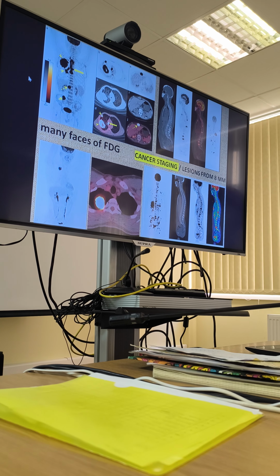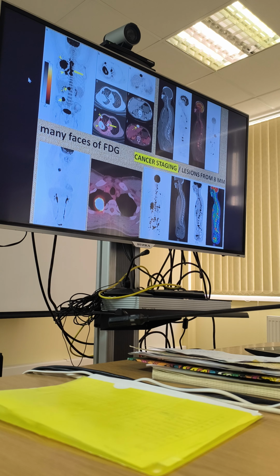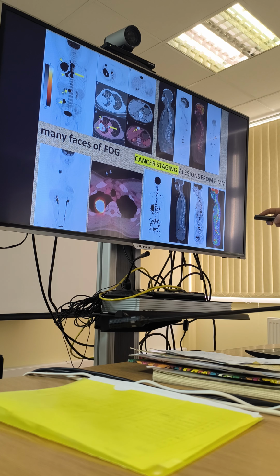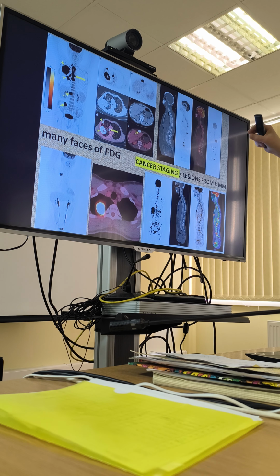Well, and let's pay attention that we like two kinds of pictures in this situation for different purposes. So we like slices because they can show us details where the metastases are situated. And so if we compare CT, PET, and this fused image, we can figure out where exactly each hotspot belongs to.